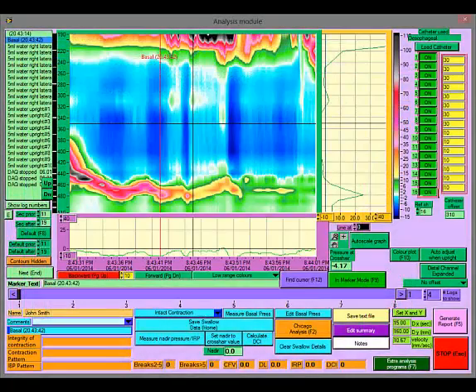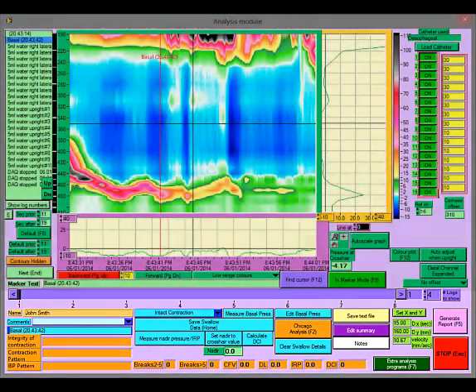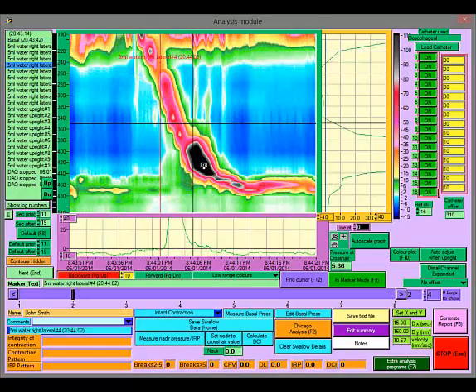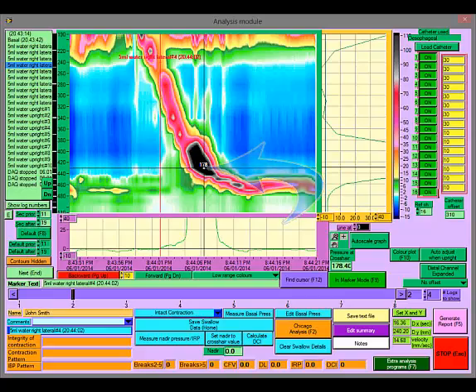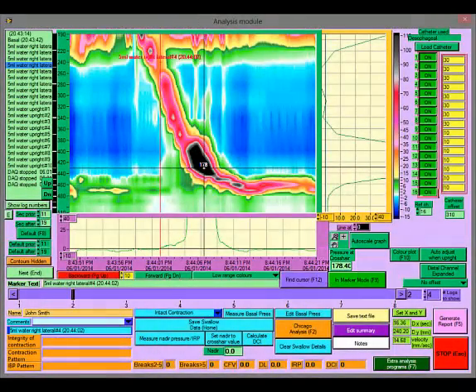The controls for analysis are located below the purple timeline bar. Click on a marker to select the swallow. To view pressures at particular points, move the cursor over the point at which you wish to measure the pressure. You will notice that the value in the pressure crosshair indicator updates to show the pressure at the point of the crosshairs of the cursor.